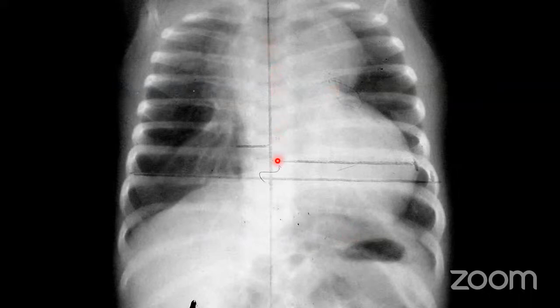Just draw a perpendicular line through the spinous process, go to the maximum diameter to the right, and go to the maximum diameter to the left. If you join this, say this is O, this is A, this is B. So AO and OB together is the cardiac diameter. And then take the maximum transthoracic diameter. My teaching was to go from the topmost part of the right dome of the diaphragm, and this transverse diameter is called the thoracic diameter.